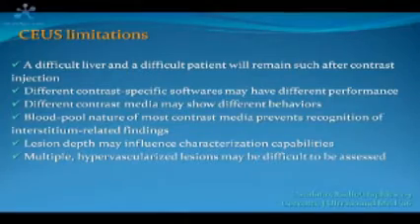Of course, CEUS has a number of limitations. A liver and a patient which is difficult to be evaluated at baseline ultrasound will still be difficult after contrast injection. So CEUS will not save a difficult ultrasound scan as a general rule. Different software from different manufacturers may perform differently. Different contrast media, when they will be available, may behave differently.